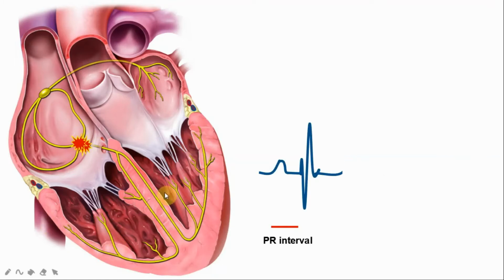In the ECG, the P wave represents the atrial depolarization, the PR interval is the AV nodal delay, the QRS complex is the ventricular depolarization and the T wave is the ventricular repolarization. This goes on and on. So, the normal ECG is very easy to comprehend. One thing to remember is that a positive deflection of the ECG means that the cardiac impulse is passing towards the lead. On the other hand, a negative deflection means that the cardiac impulse is passing away from the particular lead. Excellent stuff, isn't it?